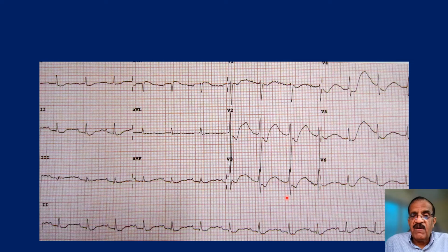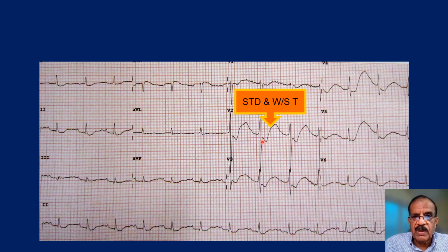So we have covered hyperkalemia, and I think now you can guess what should be next in the logical sequence. Now let's examine this ECG. You have ST depression. This is the isoelectric line. This is the PR interval. If you draw a line here, it should be isoelectric, and you can see that the ST is depressed. So one significant finding in this ECG is ST depression.